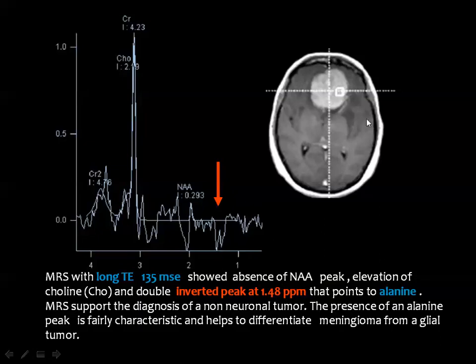But if the voxel is present on a necrotic area or an area of gliosis and so on, then you know that you are dealing with the lactate peak because of the appearance on the MRI. And you all know that we cannot interpret the MR spectrum without looking at the MR images.